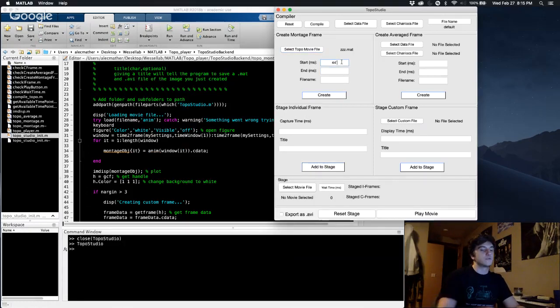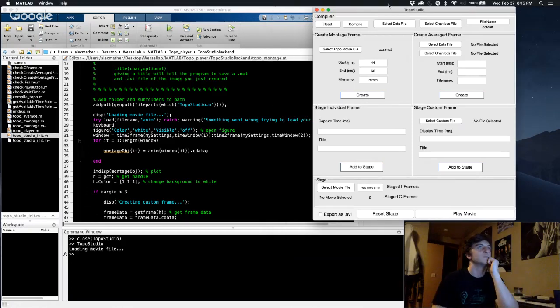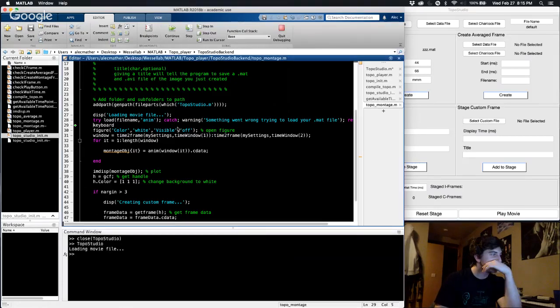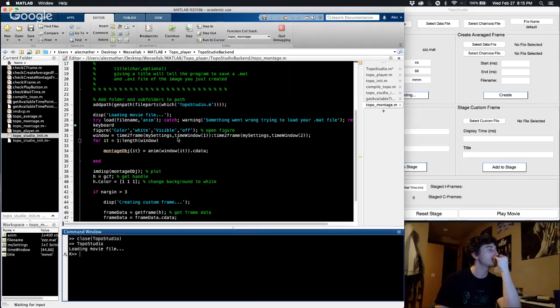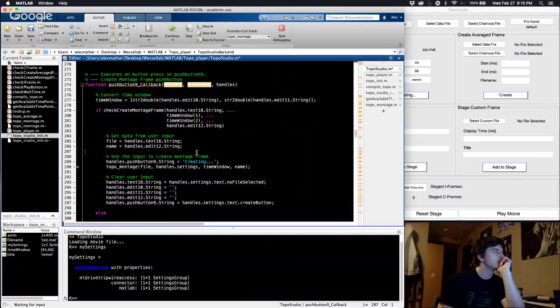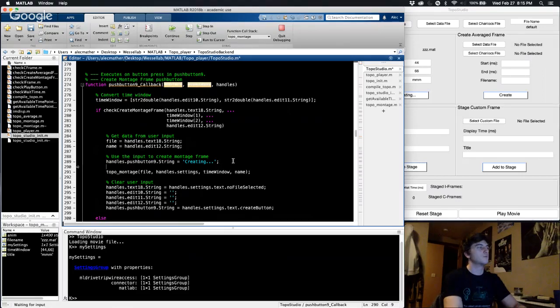Let's see, 44 through 66. We keyboard into here. Oh, see, now that's still interesting. I'm going to keyboard here instead.